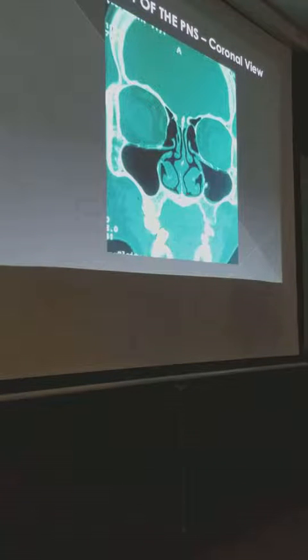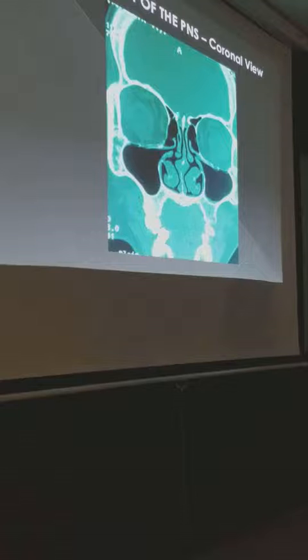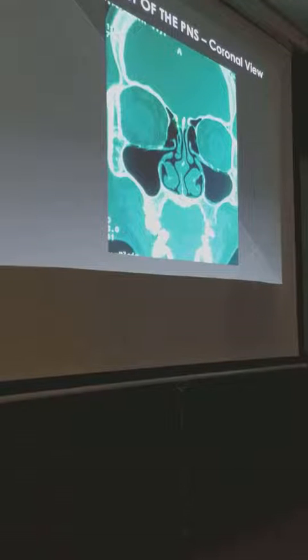Okay, so we have seen, this is the first lamella of your middle turbinate. I forgot to tell you. We can still see it here. As you can see, the first lamella is attached just across the lateral lamella of the cribriform plate. Agree? So that's your first lamella.